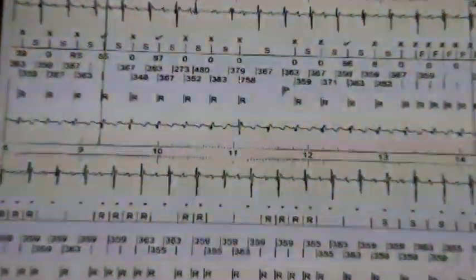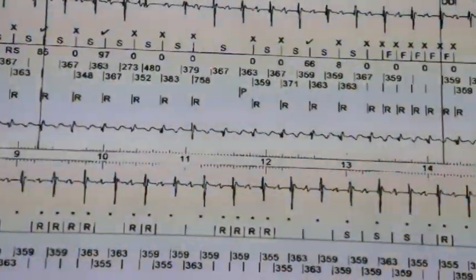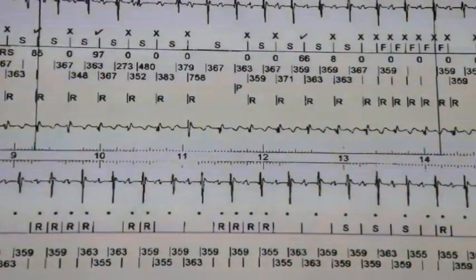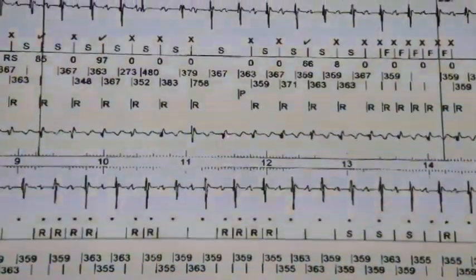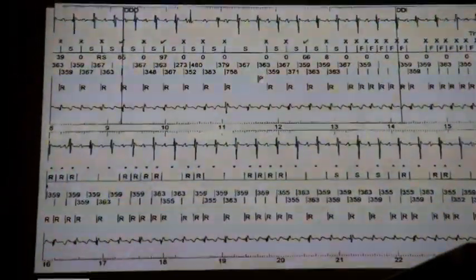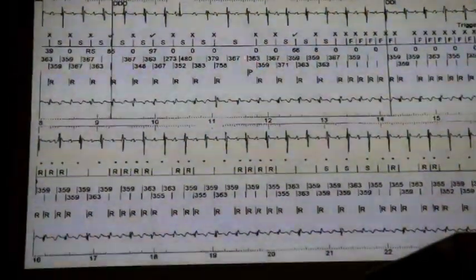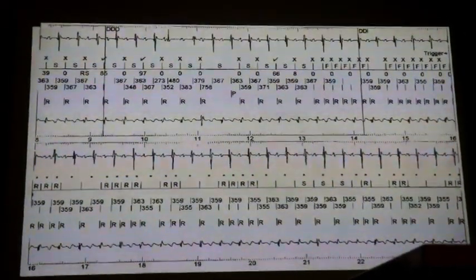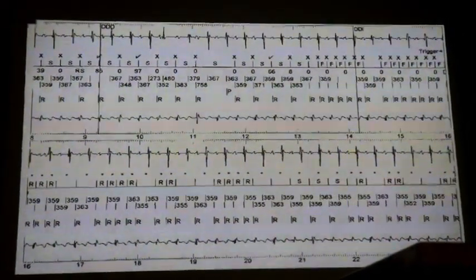A through the V. They didn't see the V. There's no V sense, right? There is a V. There it is. But the device doesn't see it. Actually, it didn't actually pace it. So we've got some undersensing, small R waves, and then what happens here?